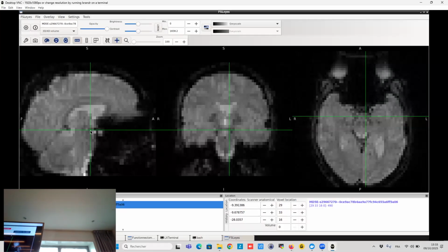You good? So that's it. You have your Functionnectome. If you want to redo it on a 4D image, it will take more time, so you need a big computer to do it.